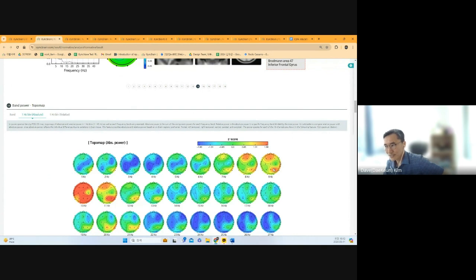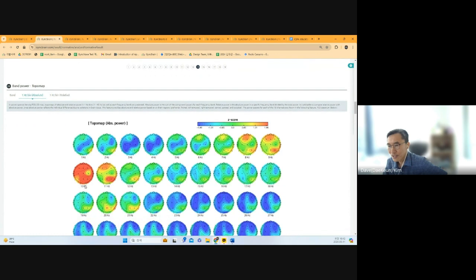The temporal T6 and P4 alpha activity reflects emotional trauma, and frontal slow alpha excess is a reflection of the depression. And also global alpha rhythm shows fatigue, usually seen in a healthy population. That means posterior alpha moves toward the anterior direction, and global alpha means a kind of fatigue status of the brain. So the brain needs to relax more.